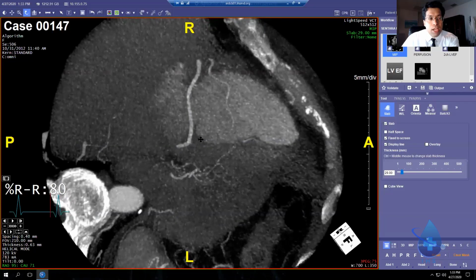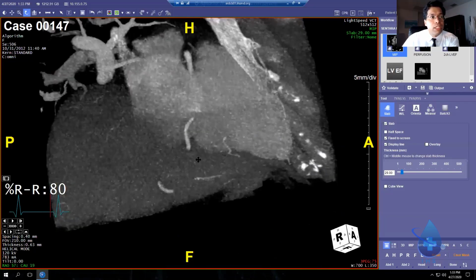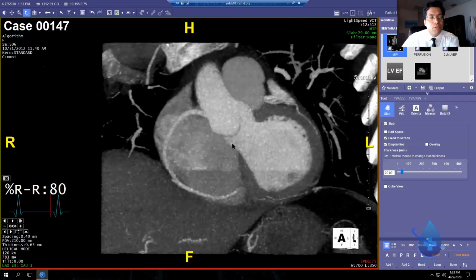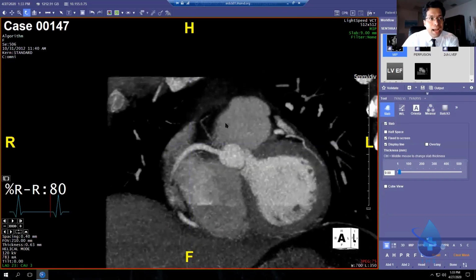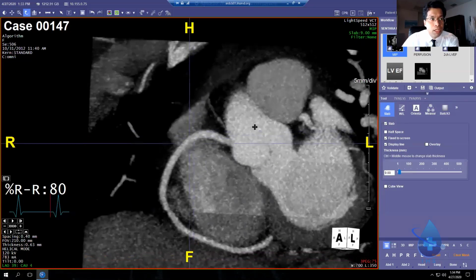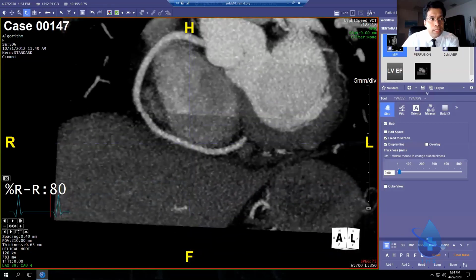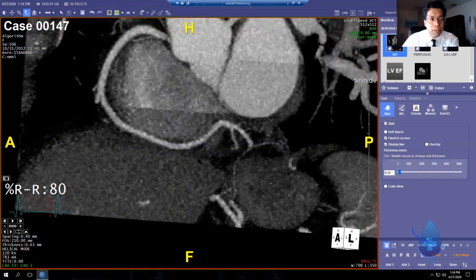So if you don't say this is normal, I think it's because you're a good cardiologist and you've only been at this for a few hours. Mostly when people, on the first day of this course, look at this, they say, I'm not comfortable calling this normal. It looks diffusely diseased. There's all these little pixels and slice artifacts. And that's good. That means you're just being super careful.